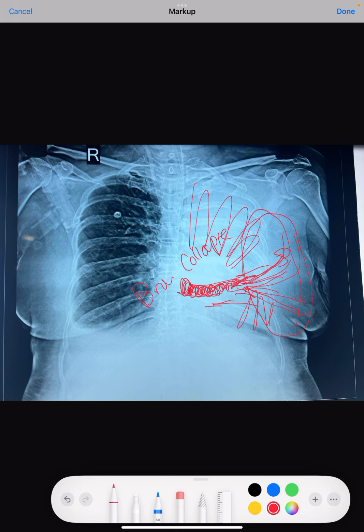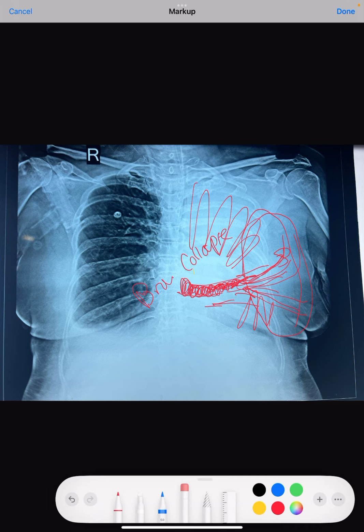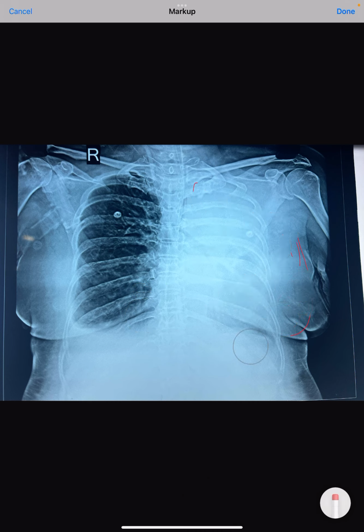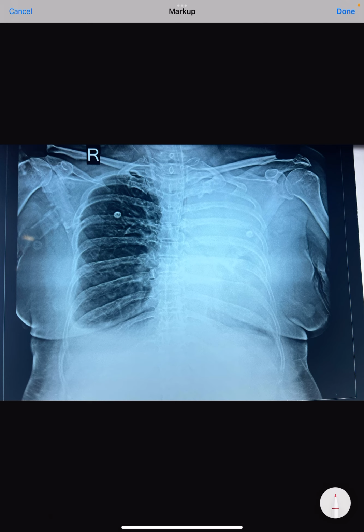Now, why would someone have complete blockage by a mucus plug? Or why would someone's bronchi get completely blocked? It's very easy. Anytime the patient is intubated, we need to understand the endotracheal tube. If you focus on this area, this is basically the endotracheal tube.